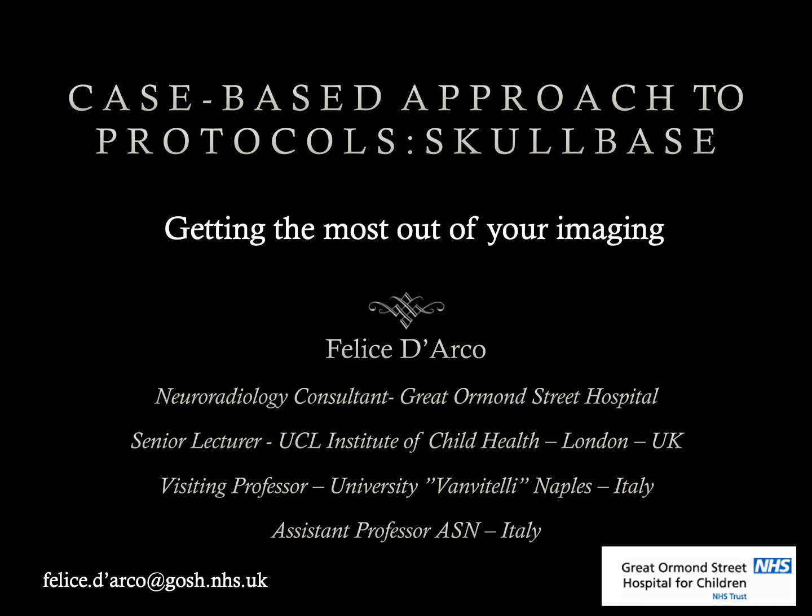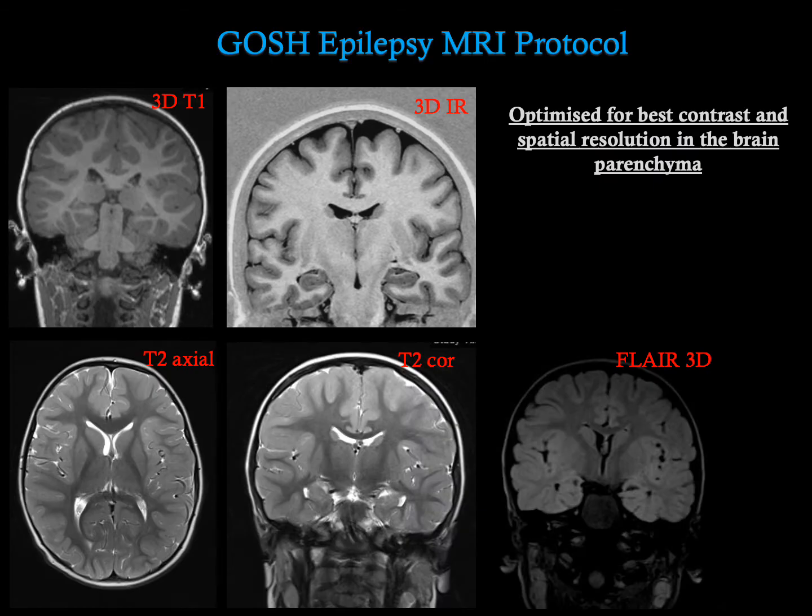My name is Felice D'Arco, and I will be speaking about your perfect MRI protocol for skull-base imaging. Let's start from the typical protocol that we use for the brain. I'm showing you here the epilepsy protocol because an epilepsy protocol by definition is an optimized protocol for the best contrast and spatial resolution in the brain parenchyma.